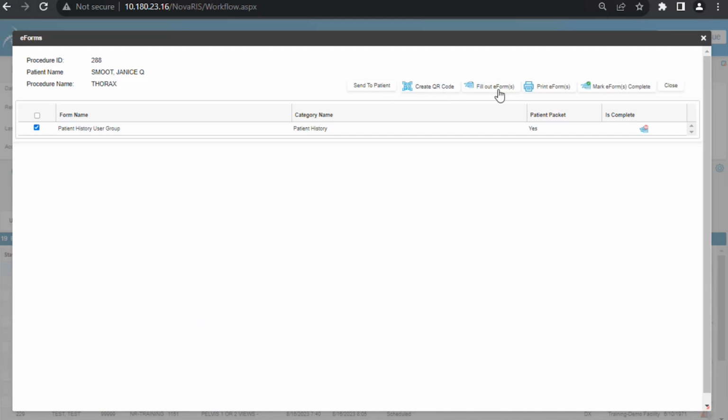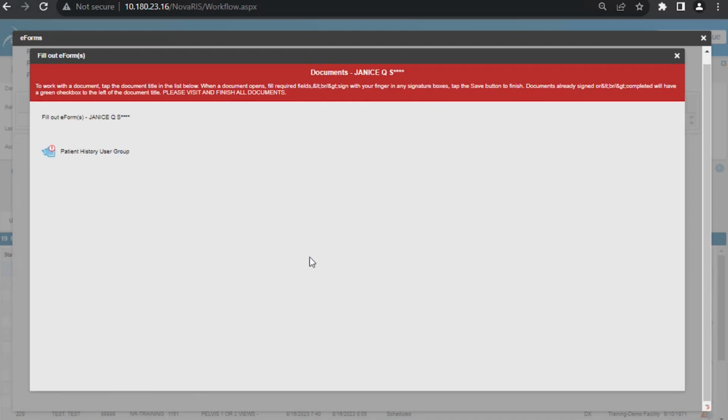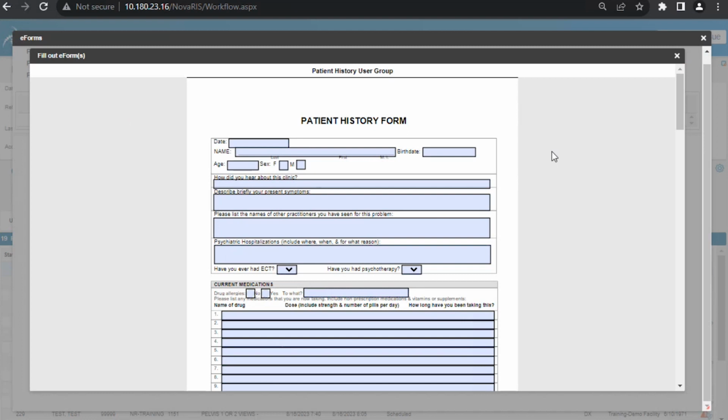If it's a patient that has difficulty with technology, maybe one of the things is that you can just help them fill that document. So if I fill this document, you can see right here. Okay, there it goes. It took a little while to load. And when it's loaded, since I don't have all my fields linked to my database, that is why everything is empty.